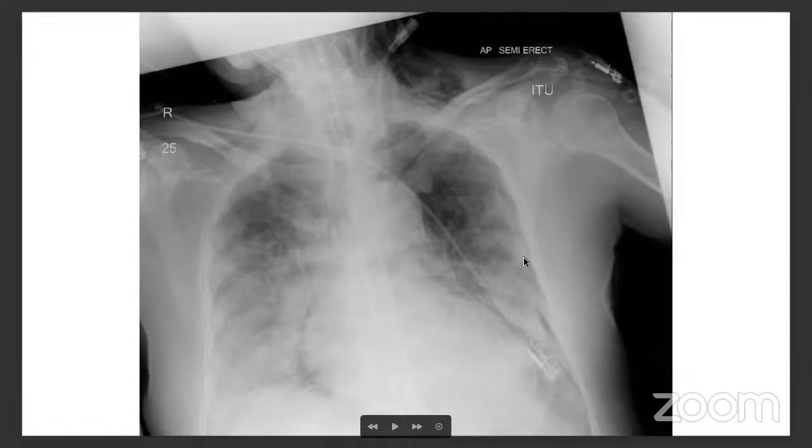A pseudopneumothorax, which is caused by different things externally, like a blanket, tubes or a skin fold, can have thick margins like this. Also, when a patient has underlying fibrosis, or the underlying lung doesn't behave like a normal lung, they can also have a thicker line. So in this patient, underlying lung fibrosis caused this thick line in the pneumothorax.